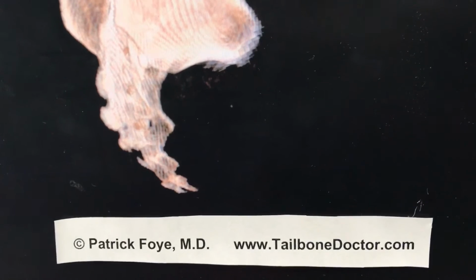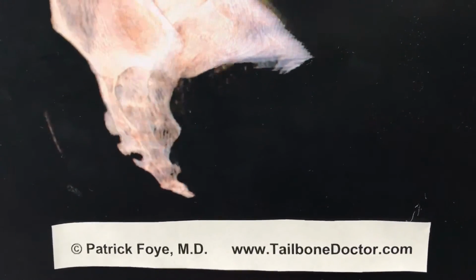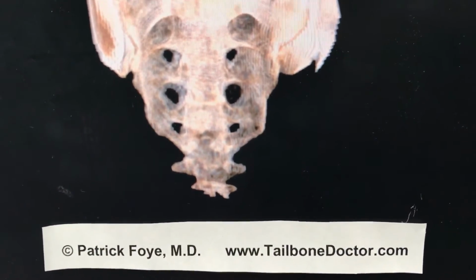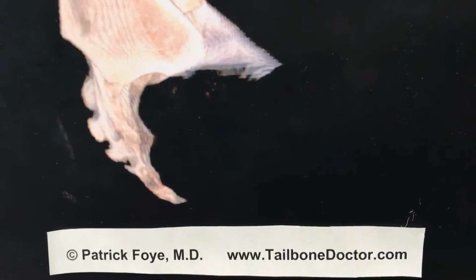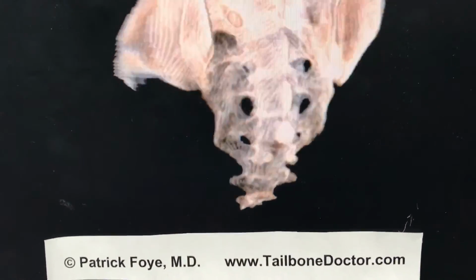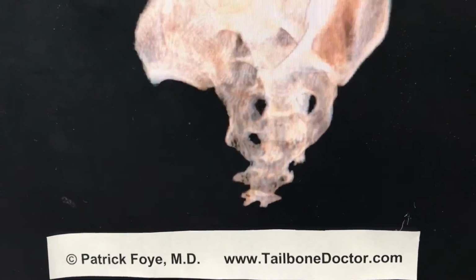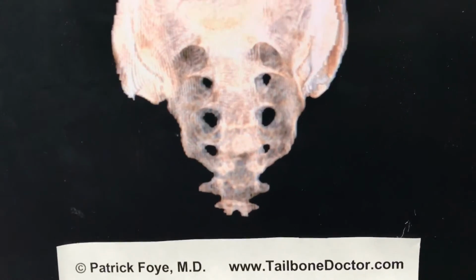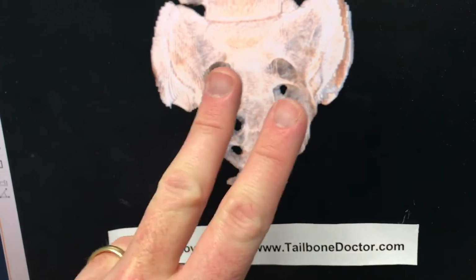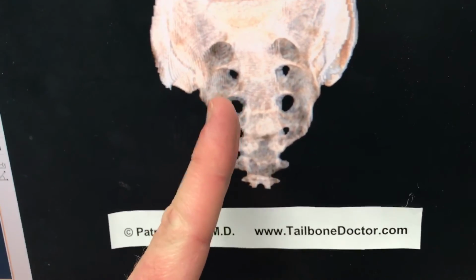Having a CT scan with 3D reconstruction like this allows me to rotate the image bit by bit to look from multiple different angles on the computer screen, so that I can decide whether this was just an anatomic variation, similar to the way rotating my fingers here allows me to see that there's two fingers rather than just one.